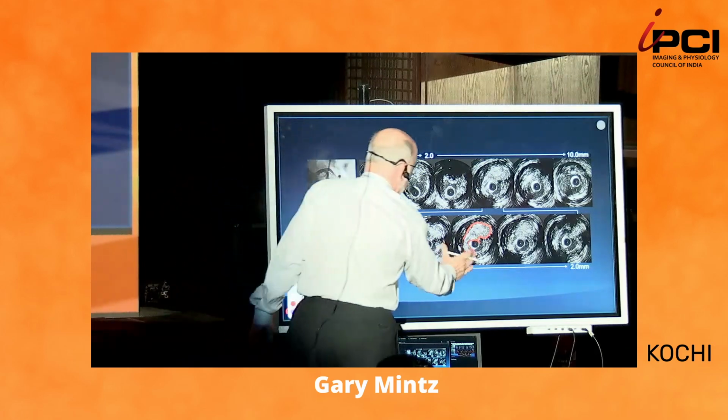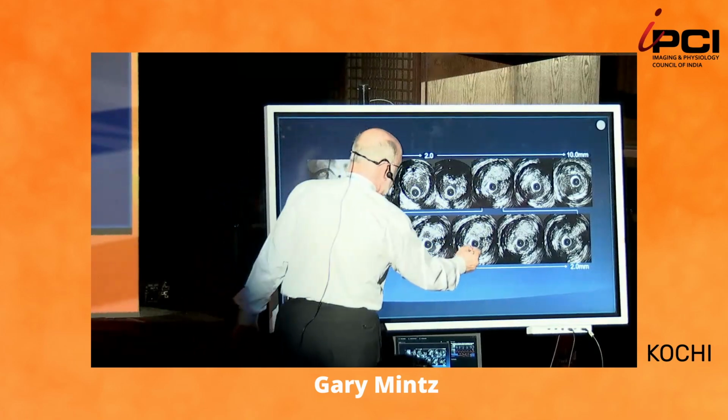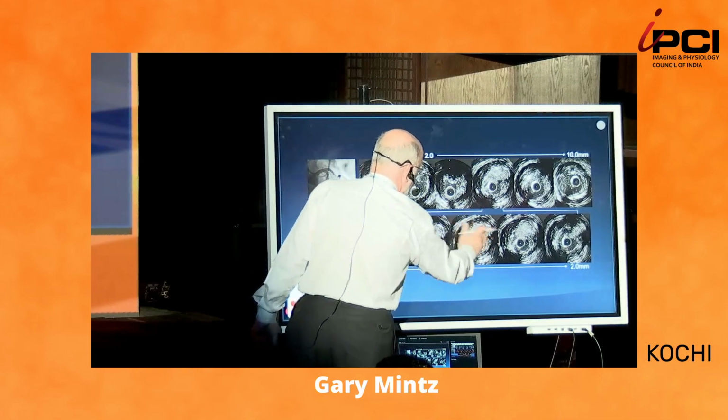But this is an unusual case. I don't have many of these in my collection, but you can see that the thrombus is clearly inside the cavity and extends out to compromise the lumen.